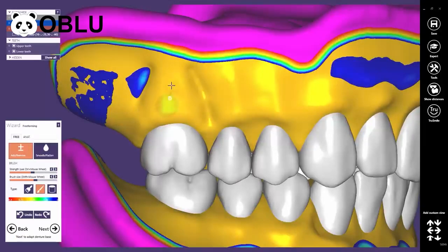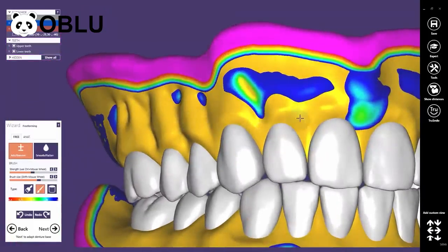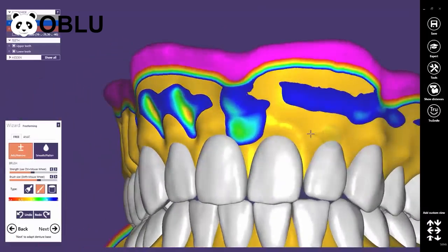It may also help you to make the digital gingiva look realistic or lifelike by mimicking the roots of the teeth and the gingival pockets. Choose the brush type, point of knife, in the medium size to design the roots. With a little practice, you will achieve very realistic results.